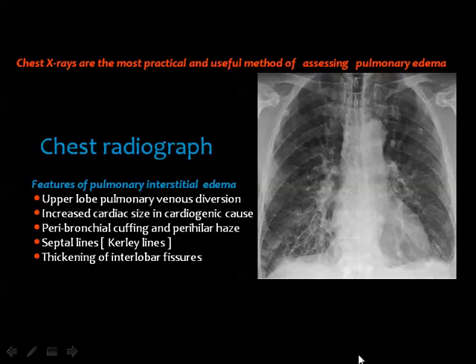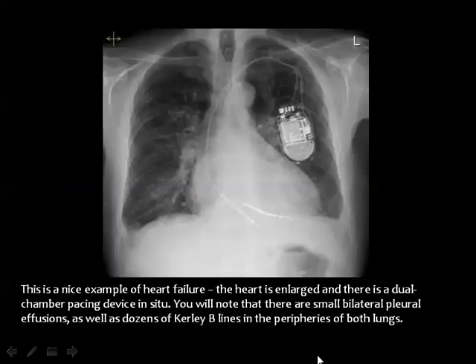Then, if you look to the chest X-ray with interstitial pulmonary edema due to cardiac problem, then you got enlargement of the cardiac shadow and too many interstitial opacities. Then how can you know that these are interstitial opacities? You go to the high resolution CT. And how can you know that this is cardiogenic pulmonary edema? You look to the cardiac shadow.